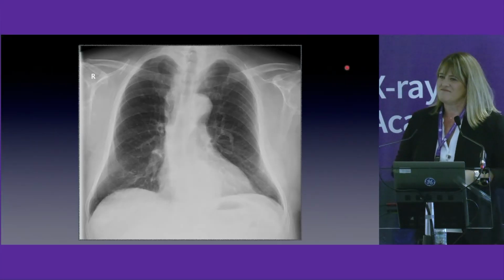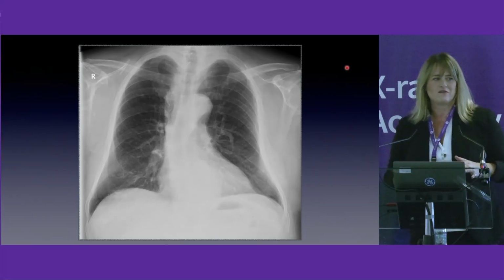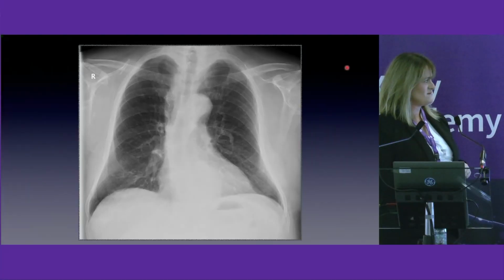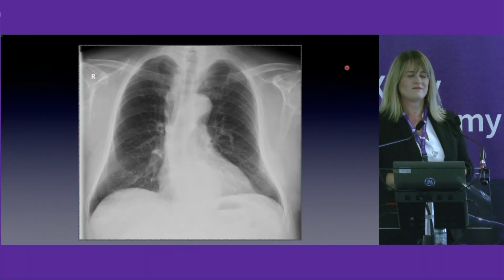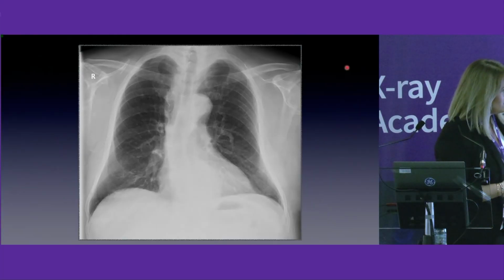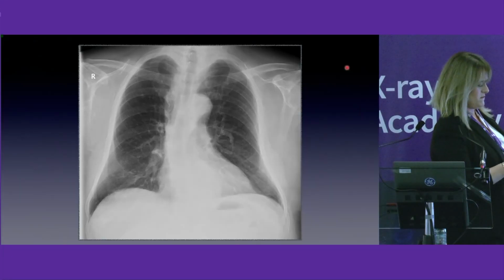Can anyone tell me something about this chest X-ray? Anything wrong? Is it normal?